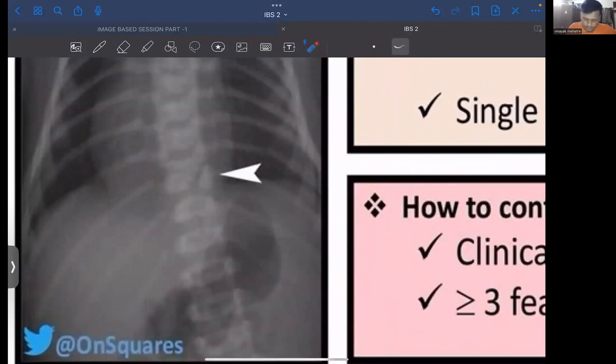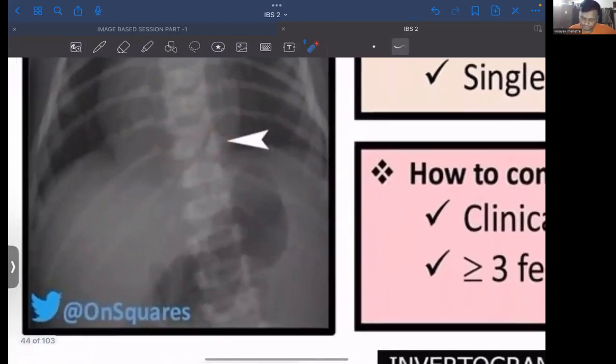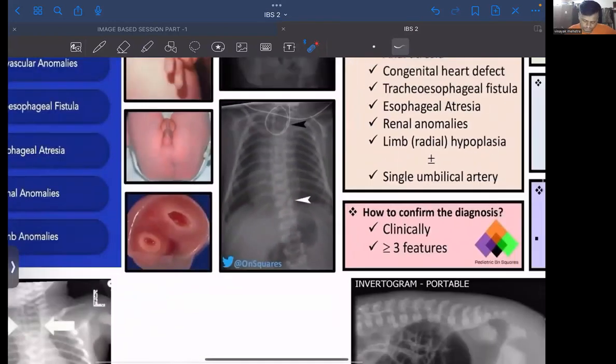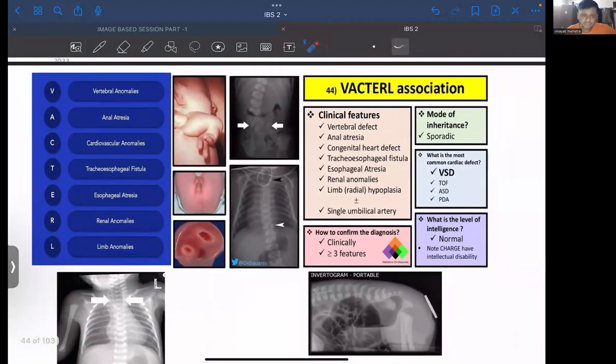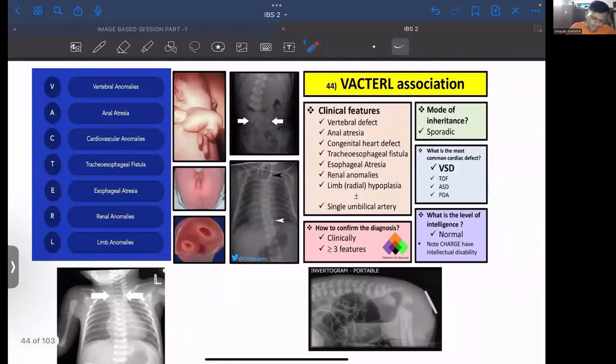Take a look. Vertebra normal है. What has happened over here? This is vertebral defect. Okay, not complete vertebra. ये बचा हुआ है पूछने के लिए भी. Okay, please take a look at this image whenever you are going to get the PDF. आएगा.